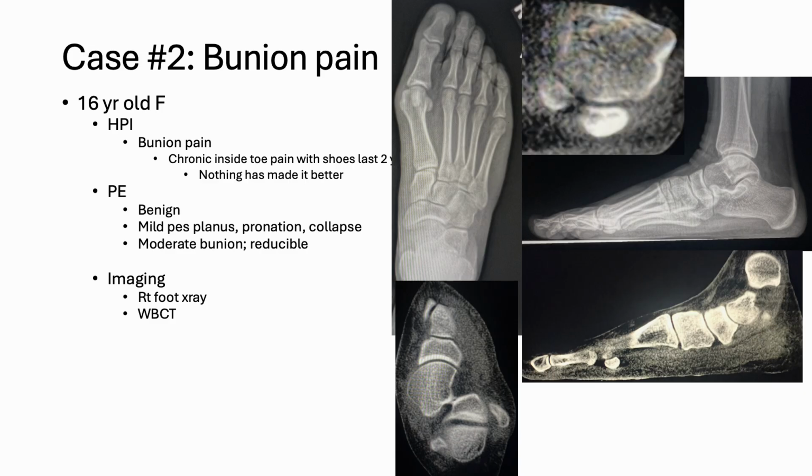This is what the sesamoids and first metatarsal look like. You can see that there's really no major crista there. It's really non-existent in my opinion. The sesamoids aren't subluxating. She is rotating, so she does have first metatarsal pronation. So what this means to me is I probably don't need to do a lateral release. And based on the weight-bearing CT scan, I should do a calcaneal osteotomy, like an Evans, which will help the first ray as well. And then I also do a first tarsometatarsal joint procedure to depronate it and help get rid of any elevatus through that first tarsometatarsal joint and give robust correction.